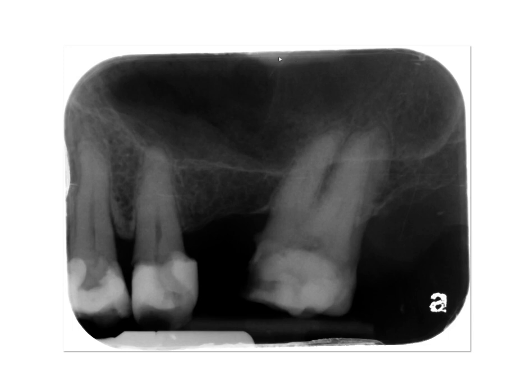And it's a little hard to differentiate which one's the zygomatic process of maxilla and which is the zygoma, because we want to be able to see that U or J-shaped opacity. If I had to presume, this will extend something like that, such that this is the zygomatic process of maxilla, and then the posterior extent is the inferior portion of the zygoma, but we really do not have a good visualization of the area.